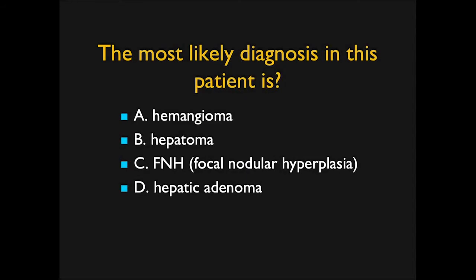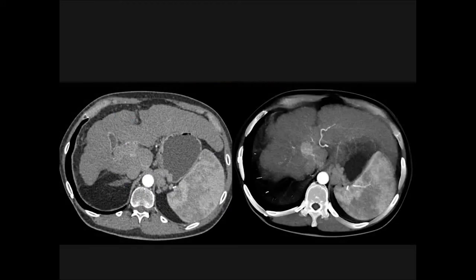In this case, I asked for the most likely diagnosis. Forget the answers I listed. Look at the liver. The liver on the axials and the volume rendering is markedly cirrhotic. And then you see evidence, best shown on the 3D, of a 2.5 centimeter hypervascular lesion. And if you look back toward the venous, you can see the lesion is there, or rather to the axial. The lesion is there, and there's some neovascularity.